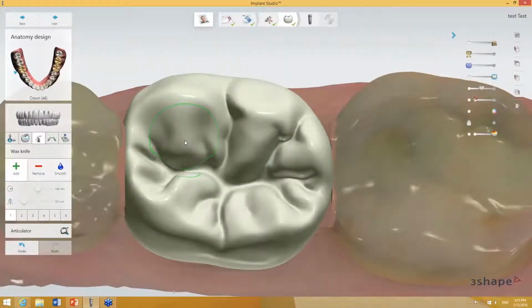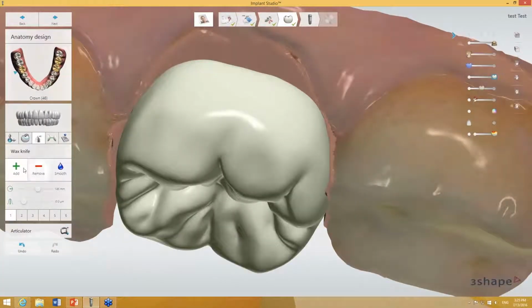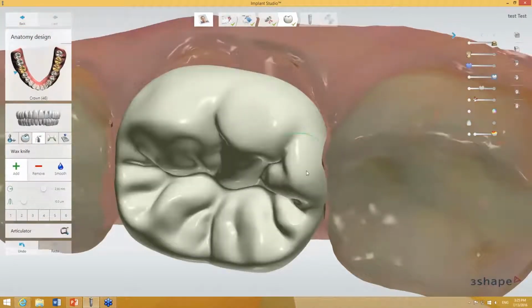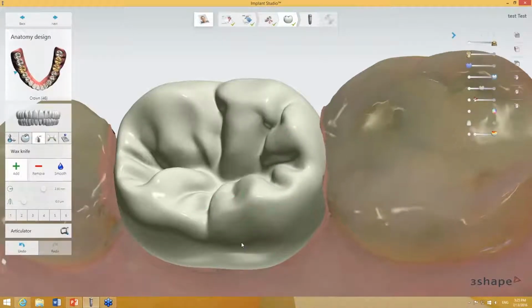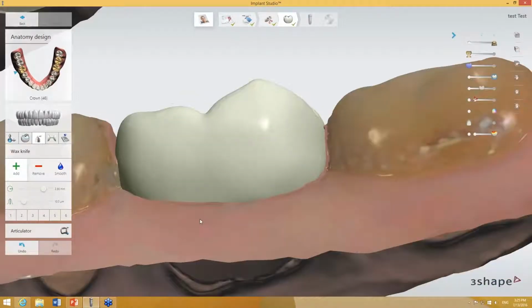There are two tools that I'm very often using, and they are useful for more sophisticated design. The first one is a big radius of the adding tool and a small level, small volume. This is a very nice, gentle smoothing tool, and it's smoothing by gently adding material to make sure that it's not going to be too thin.